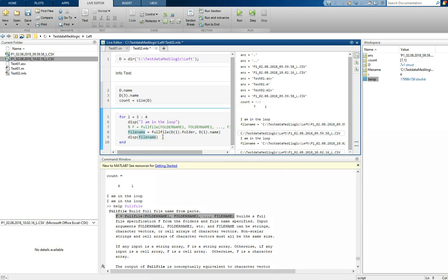Looks pretty good. And now we can read this data, and we read it in a temporary variable, in this case with the command readmatrix. And we only have to include the file name, because this function is pretty comfortable. I used this before with the dlmread, but this one is so comfortable that I'm using that one.